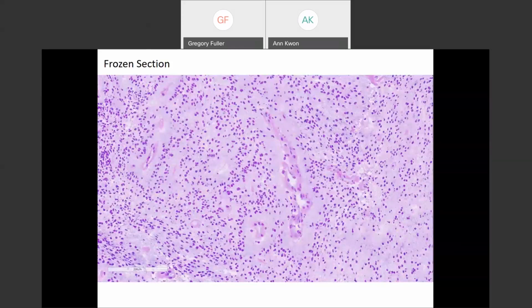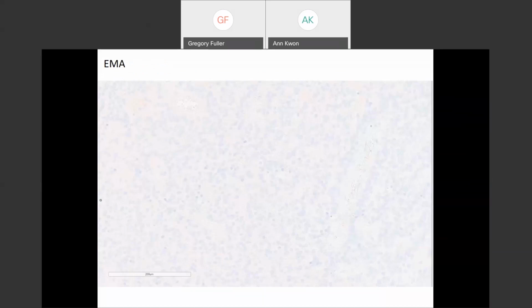They're easiest to see in a, quote, cellular ependymoma, which has been eliminated. It used to be a formal variant, believe it or not, but it's just areas of dense cellularity. They're easy to see. When the cellularity of the ependymoma is sparser, lighter, it can be more difficult to spot the pseudorosette. But you can usually find them. Of course, the chromatin pattern, et cetera.